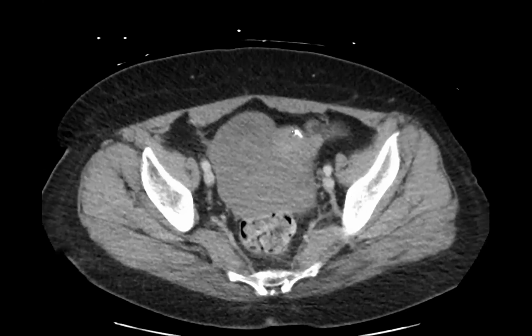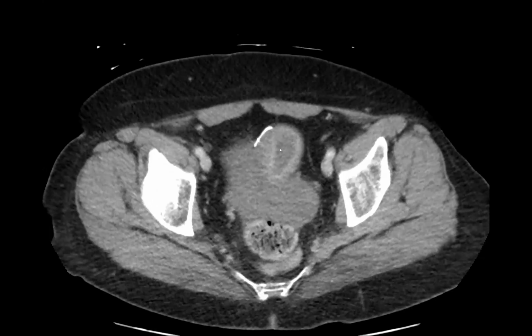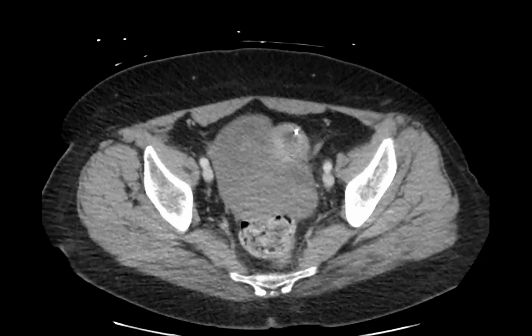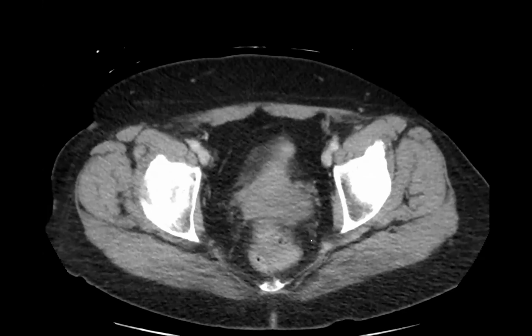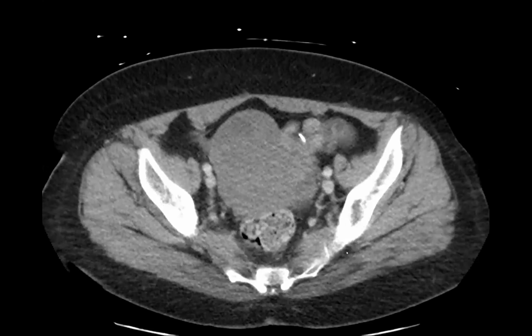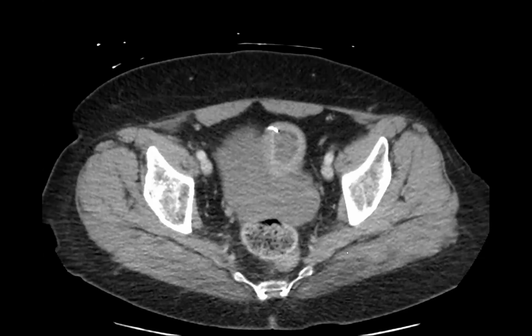So there's some Essure devices, fallopian tube closure devices. This is the endometrial cavity, looks a little thickened. The patient was postmenopausal. That's a different situation. And then we see this process here. Any thoughts? What would you recommend there?